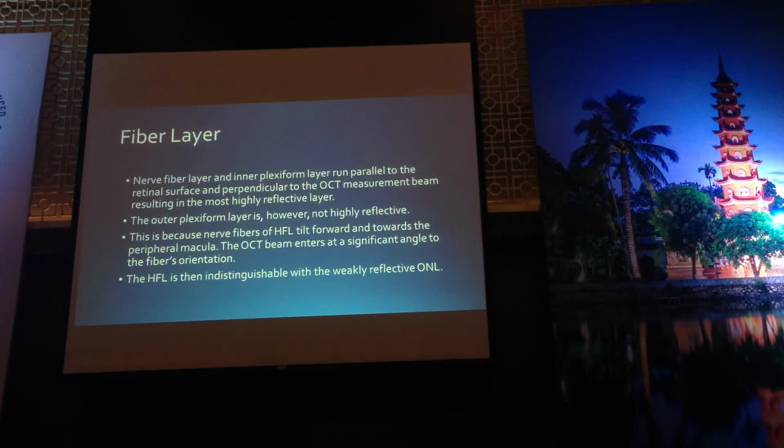And for the fiber layers, the nerve fiber layer and the inner plexiform layer run parallel to the retinal surface and perpendicular to the OCT measurement beam, as I mentioned earlier. So it results in the most highly reflective layers in the OCT strip.